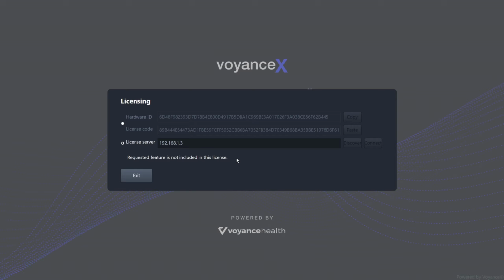Once we're done, we're going to be asked about the licensing prompt here. You may see an IP address already put in. However, if you do not see the proper IP address put in, we will now go and show you how to obtain that IP address. So moving away from the viewing computer, we're going to make our way over to the X-ray computer, the one that was provided to you by Maven Imaging.